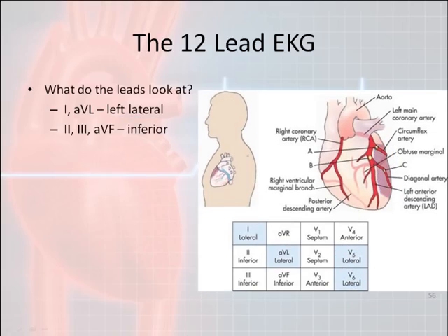If somebody is having an inferior problem, then you're going to have problems in the 2, 3, and AVF.